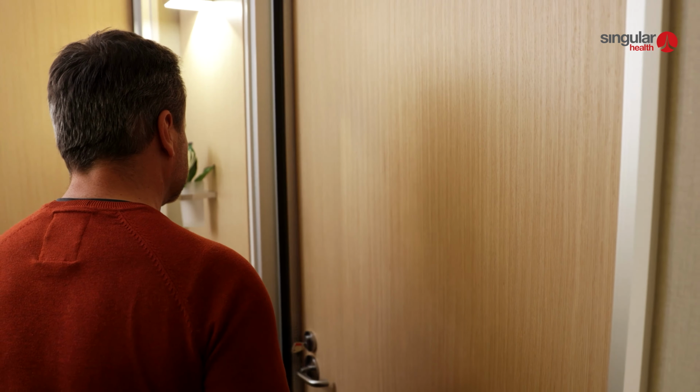Oh, hi Tom. Dr. Smith, how are you? Good to see you. Thank you very much. Come on in, have a seat. I will. We'll have a look at your scans.